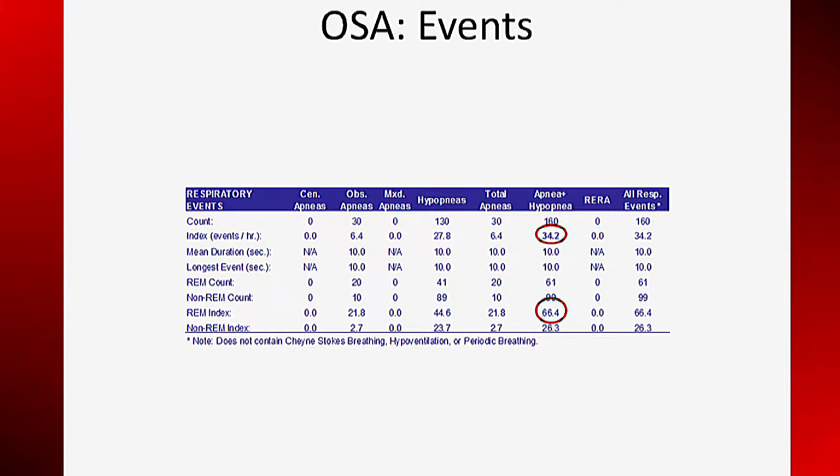Note that the REM AHI is higher still. This is a very high AHI and is very disruptive to sleep. It is doubtful that this patient has any effective REM sleep with these kind of numbers. This would account for the very short sleep latency.